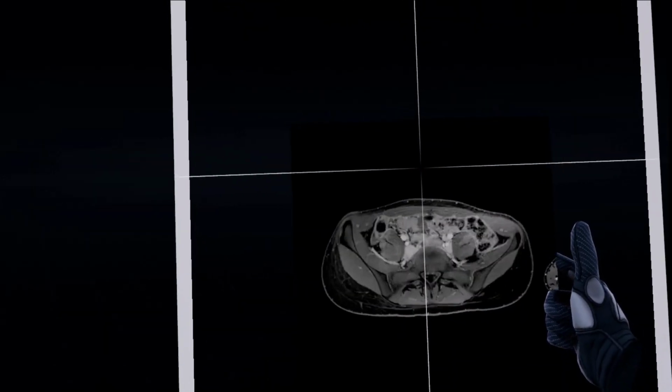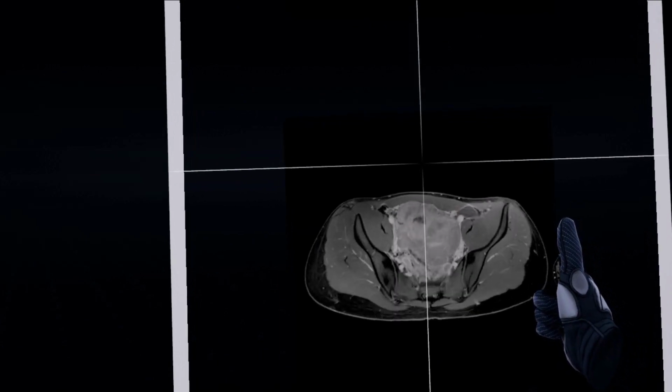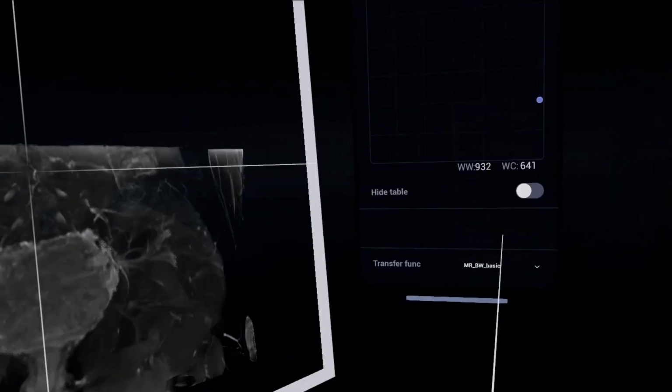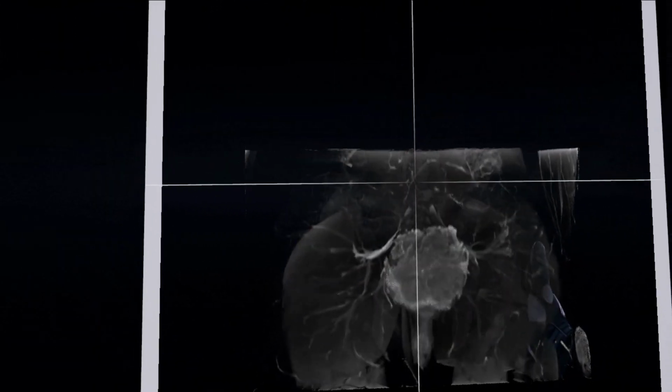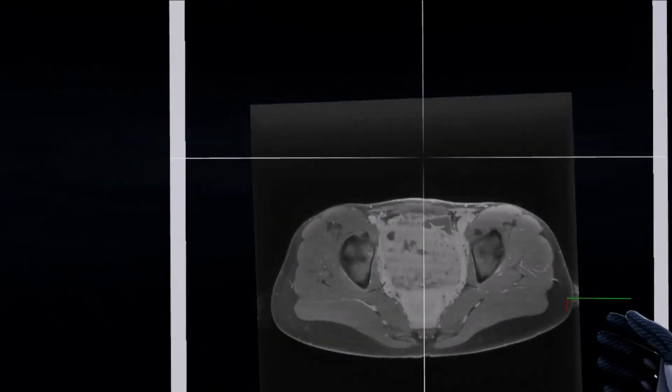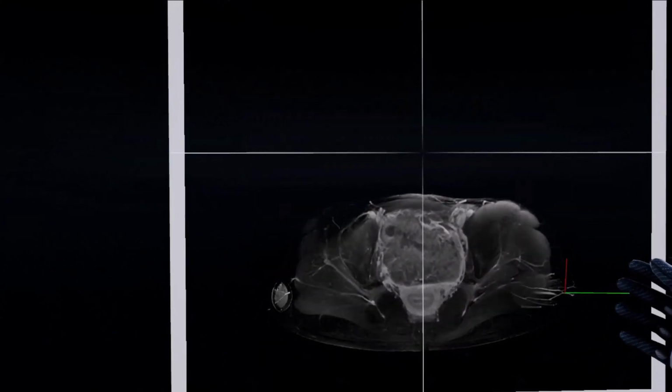a professional 2D DICOM viewer, but also to easily perform oblique reconstructions at any angle with just one movement of the hand. The use of different presets and width/level of the visualization window provides a volumetric display of contrasting structures such as the tumor, uterine layers, vessels and nerves to assess their spatial location, which is important for planning possible upcoming interventions such as biopsy or surgery.